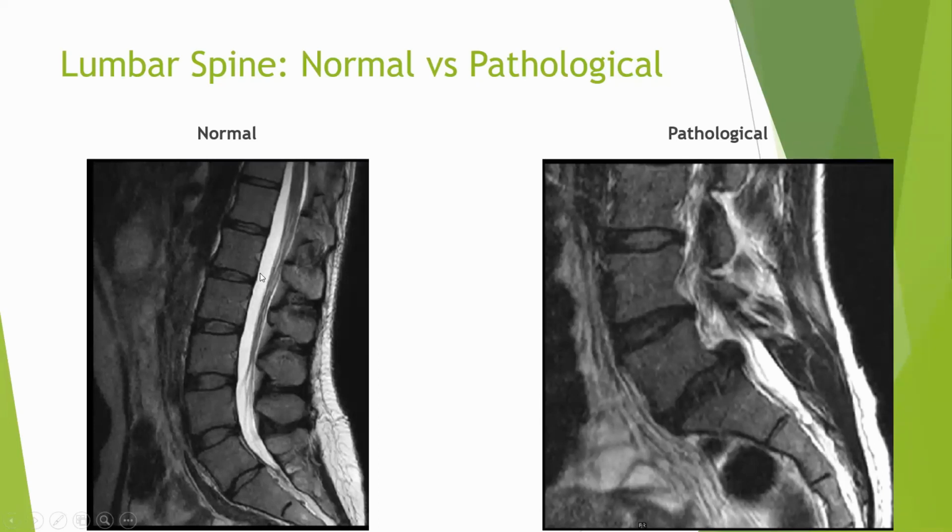Here you basically have nerve fibers going in like a horse's tail, and this is normal, but this is not. Obviously you can see a huge disc bulge and actually not a bulge, it's a herniation. I can see a little bit of bulge as well as a dripping right over here. It's trickling down, so there is a little bit of disc herniation.